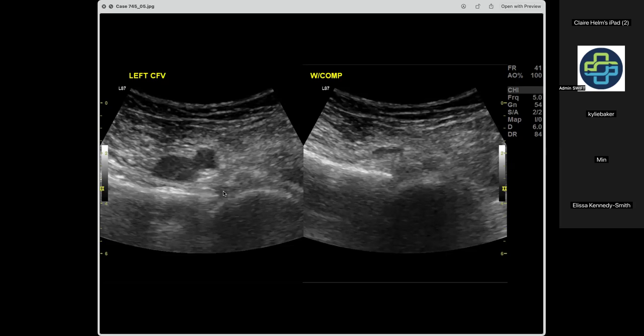So this is the sort of case that is used as justification for doing those dynamic maneuvers. And as I said, you're expected to be able to discuss whether that is reasonable, whether that is unreasonable, and what the likely miss rate is if you just do, say, a 3-point scan or a 2-point scan or a proximal scan, compared to doing a full comprehensive leg scan. Okay.